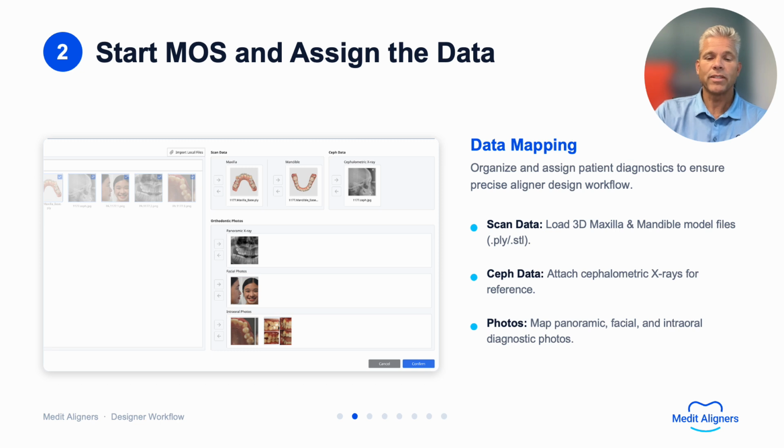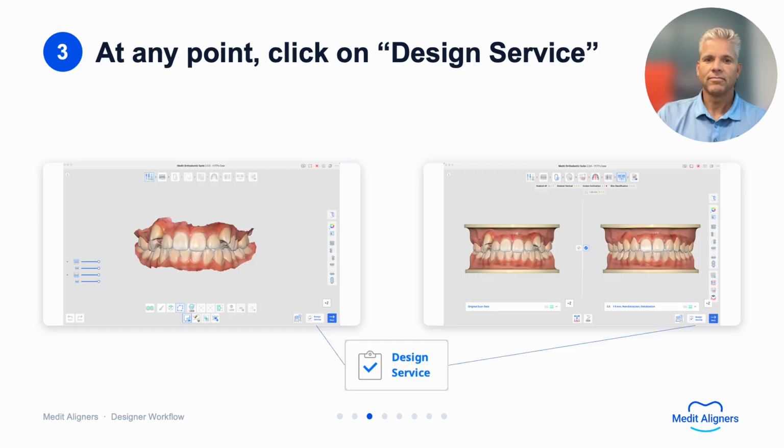When MOS opens, drag and drop the scan data, radiographs, and patient photos to their assigned locations. While radiographs and photographs are not required when submitting a case to the design team, we do recommend it so that the designers can return their very best work.